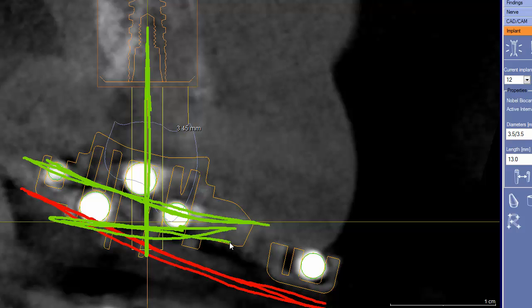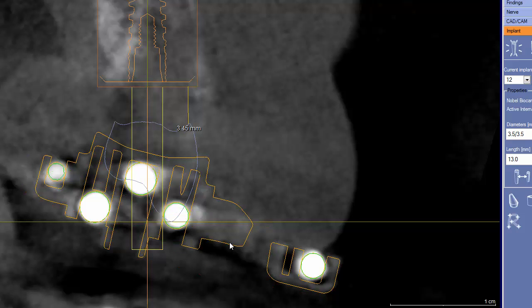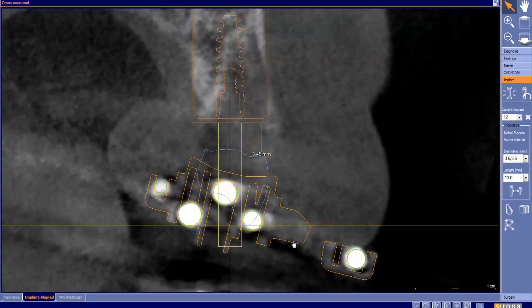Now again, the software will re-tilt when it mills, but the D2 value has to be at least that high. And I hope that didn't come across as totally confusing there. And again, these are things that are, honestly, difficult and it just takes a little bit of time. So let's focus on setting our D2 value here.